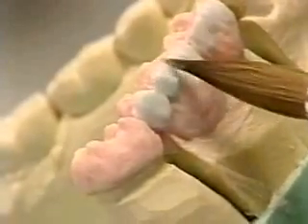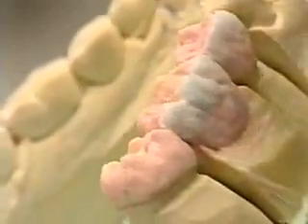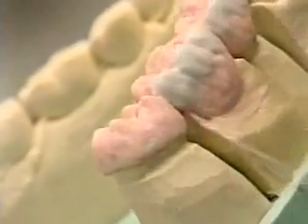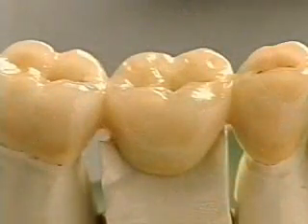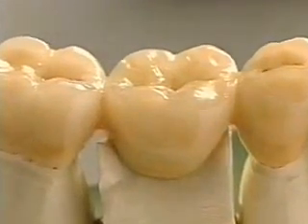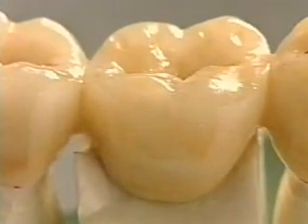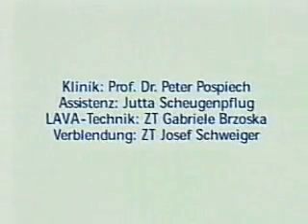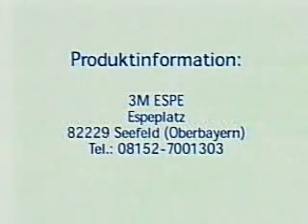Layering begins with modifiers. Then come dentin, enamel and transparent mixtures as with any other veneering ceramic. Because the frame color already has the right dentin color, there is no need for opacers. This bridge is convincing not only because of its attractive modulation and color coordination, but just because of the translucency characterized for lava. With that, you get a perfect match to adjacent teeth.